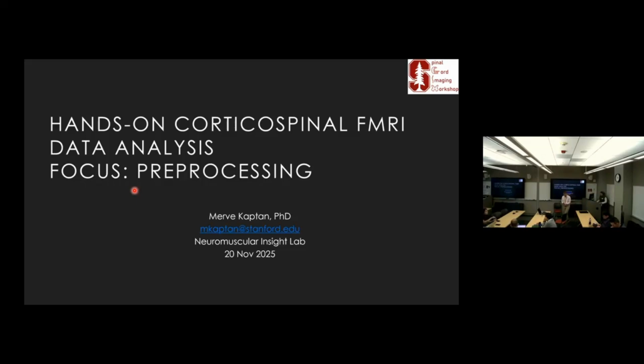Thank you. So thank you everyone for being here. This is supposed to be a very interactive session. Interrupt me at any time. So at the beginning, I plan to go over our processing pipeline, what we are doing, and then after that, we can go over the small mini tutorial, starting from how to even download Spinal Cord Toolbox and FSL and so on. We can go over that and try to figure things out together. And also I have a lot of colleagues that can help me on that too. So don't be shy, ask questions.